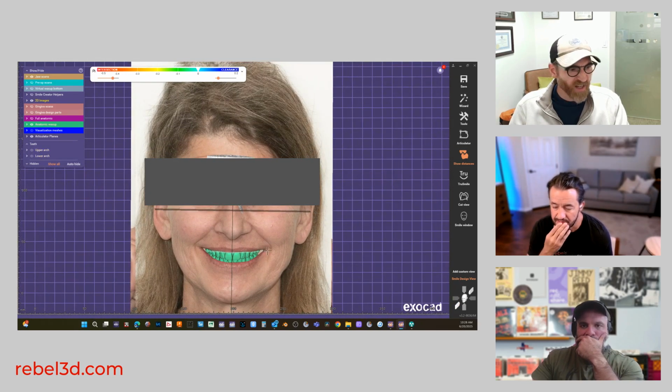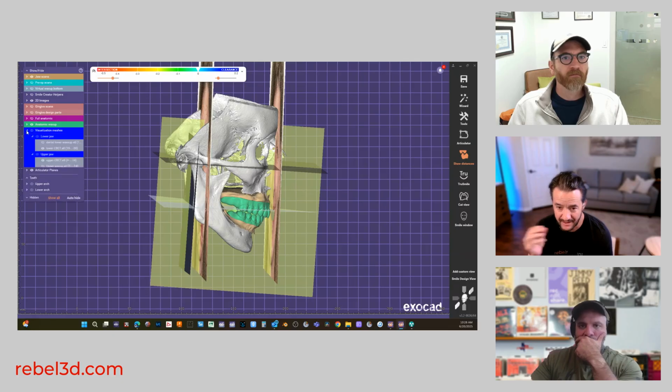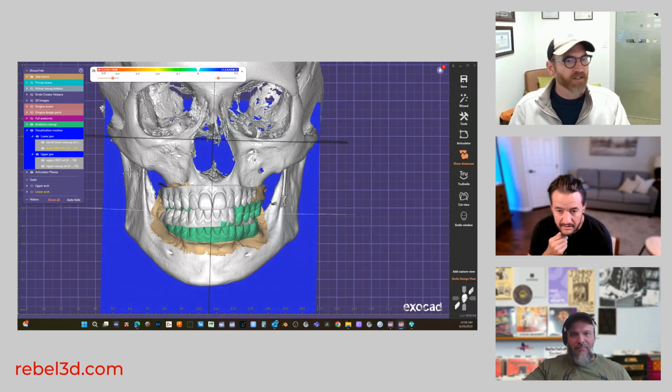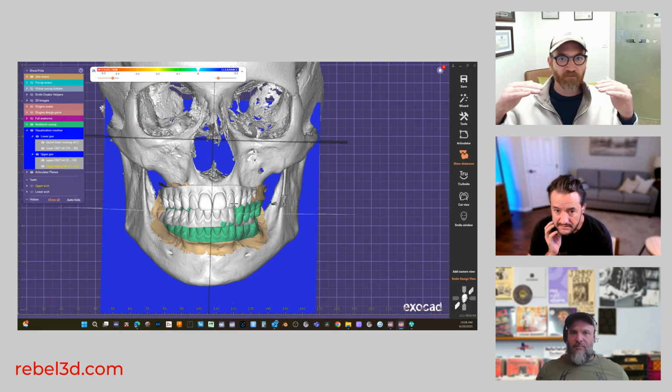So can you show Daniel's mounting that he was able to do without the condyle position information, and how it differs from your mounting? Right. And so this is how Daniel mounted the case. And basically, the midline is close, but there's a cant. So there's a potential for him to build a canted upper, right?